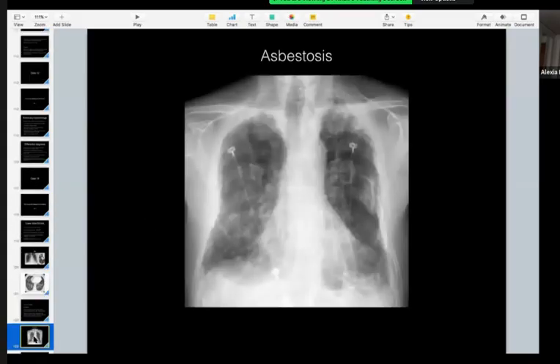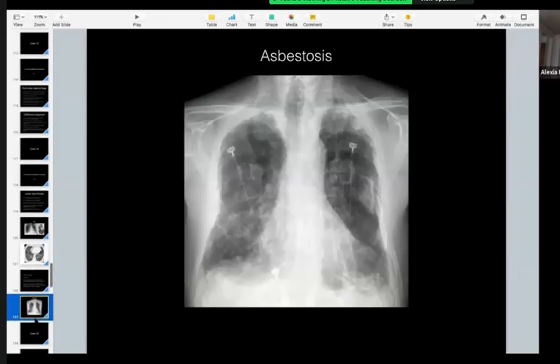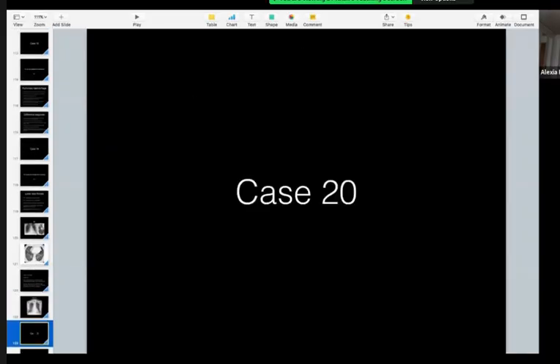And this is a chest X-ray of another patient with extensive bilateral pleural plaques, subdiaphragmatic as well. So he had asbestosis. Look for all these findings, because these would be important negatives. You can say things like, I cannot see evidence of calcified pleural plaques, which would suggest asbestosis. I can see a dilated esophagus with an air fluid level, which would point to this being part of scleroderma, just so that you can show the examiner your thought process. Thank you. You're welcome.